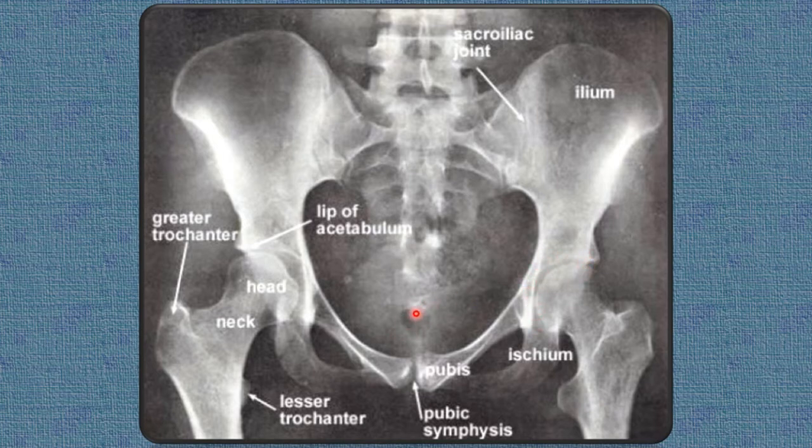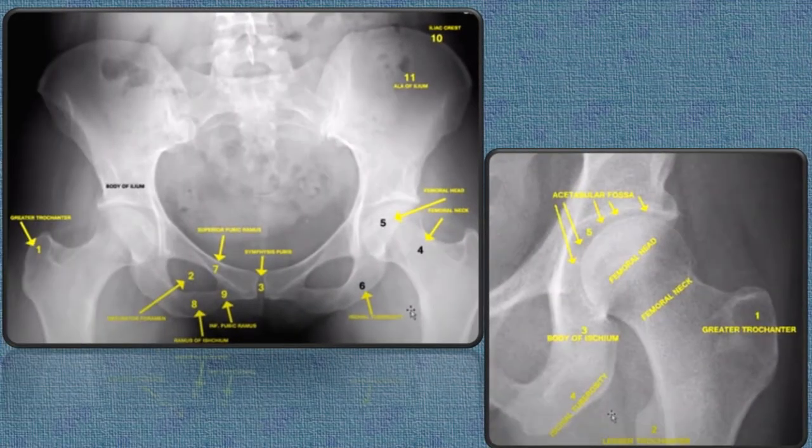right? And what are these black spots everywhere? This one you will see everywhere, not in this X-ray, but in other X-rays you will see big spots of black. So this is actually air within the intestine, because the intestines are coiled around here, so they also contain air. So these are the black shadows of this intestinal air, like this. These are black spots, right? So these black spots are actually air, nothing like an abnormality within the bone.